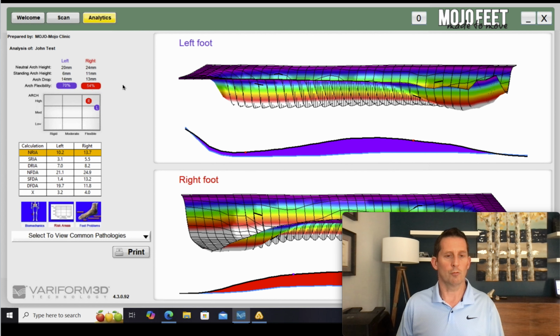So again, recapping their numbers and how they relate to the normal ranges, where they fall, and then pointing out any big difference. When I say big difference, I'm referring to 10% or more. So if it's under 10%, I may not mention it. I might take note of it, and if I see asymmetries in the patient, then we can go from there. But when it's 10% or more, I'll usually bring it up with the patient and have a chat about that.